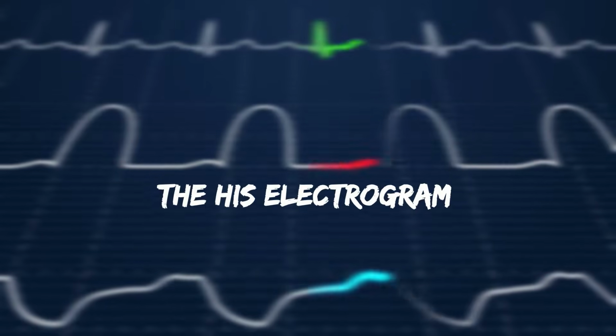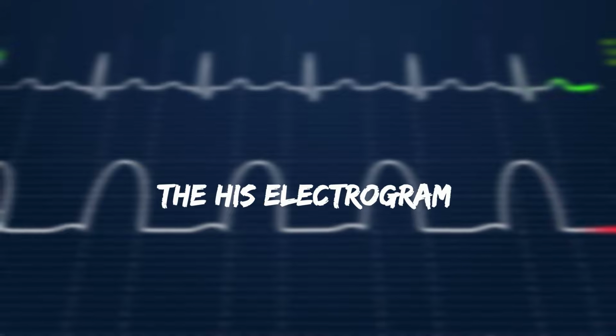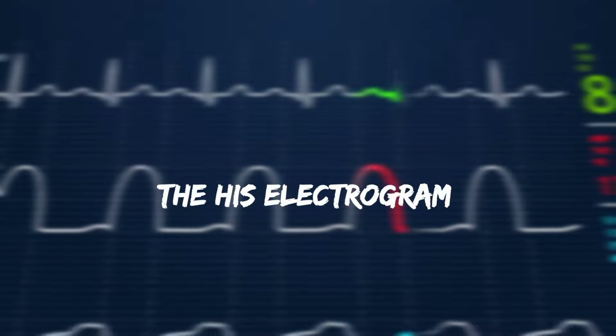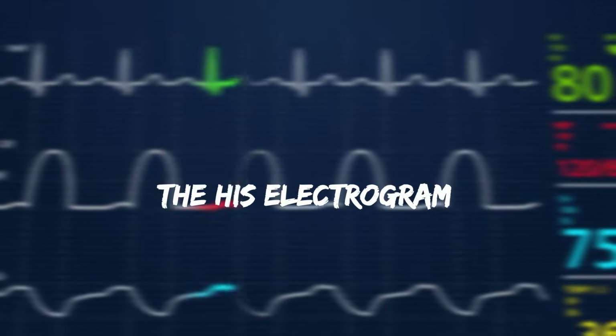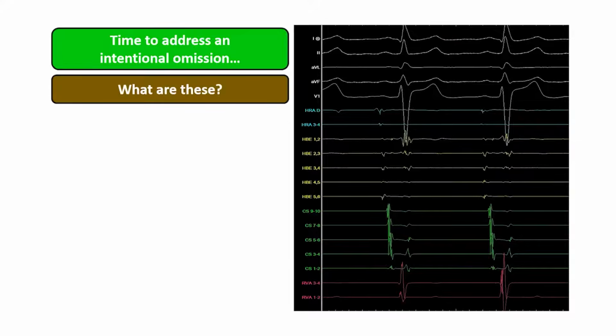All right, well, you guys did great with those practice problems. Now, time to focus on a topic that I've intentionally omitted up until now. And the purpose of this is to sort of layer on complexity one layer at a time. Well, let's take a look here at our intracardiac electrograms. And here we just see another beat of sinus rhythm. But my question now is, what are these signals here?